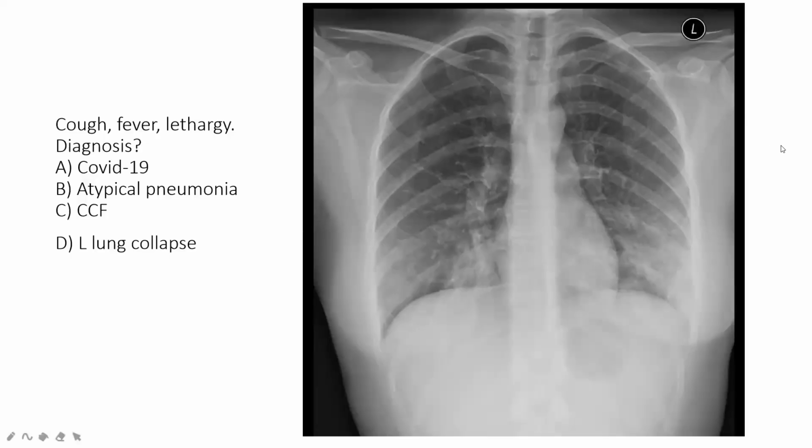Okay, so this is another case. Patient is coming with cough, fever, and feeling tired. What do people think is the most likely diagnosis based on this chest X-ray? I'll give you about 30 seconds to think about it.